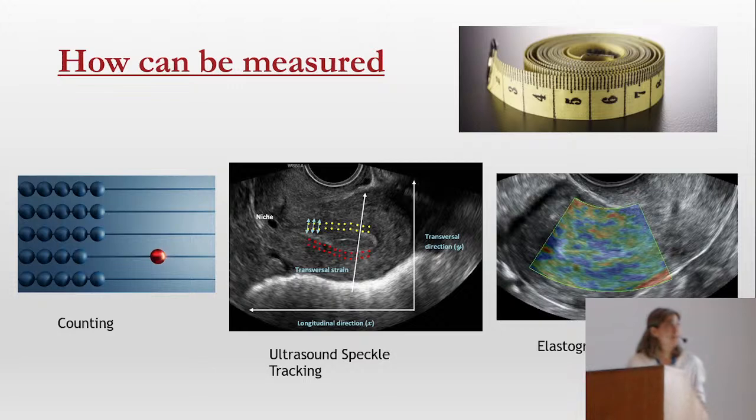And then the elastography, that I really cannot see. It's published, and you can measure the different stiffness between 2 tissues, but you have to select the tissues manually. And where are you selecting here? I don't see elastography as a way to measure uterine contractions, to be honest. So then what might be measured?